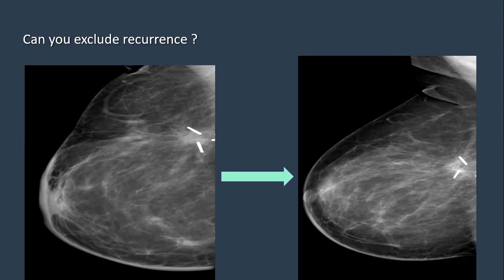A large, dense piece of dystrophic calcification at the site of surgery, or surgical scar. So how are you going to use it to manage the patient, as a predictor? Like now, we see these surgical clips.